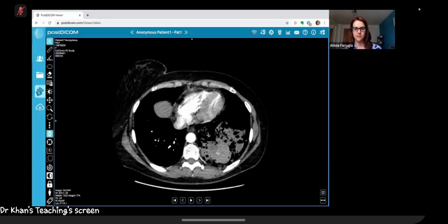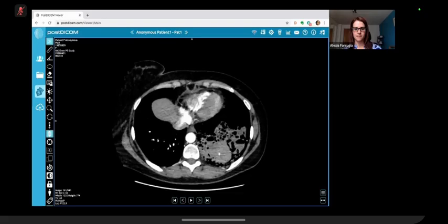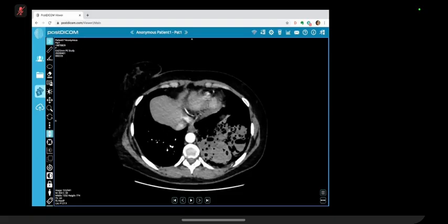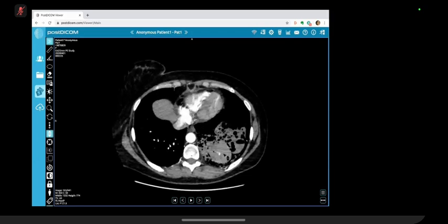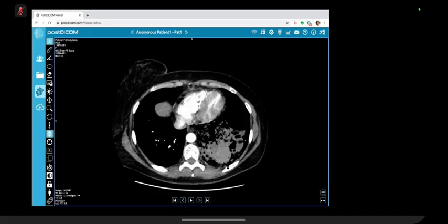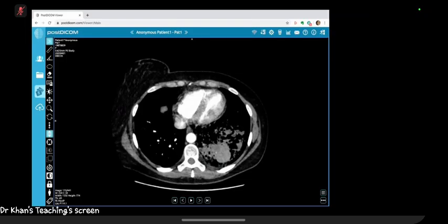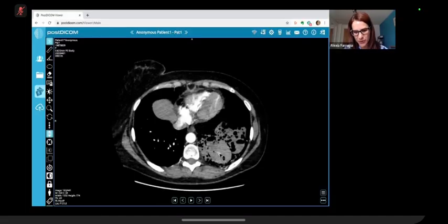Okay, so it's here. Okay, so I don't know whether that might represent an aneurysmal vessel. What about the caliber? Is it of a large caliber? Not really, no. It was just the configuration of it. It might have just been the way it was scrolling through. Sorry, this is live and it's a bit clunky. No, don't apologise. It's lovely. Thank you. A bit clunky, but anyway, if we follow this, yeah.